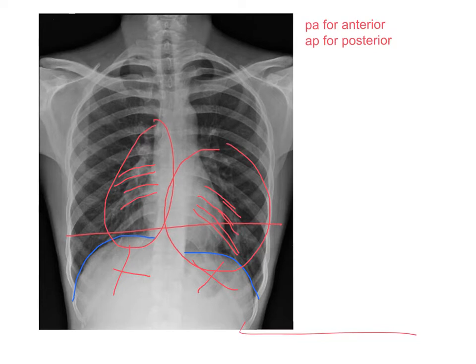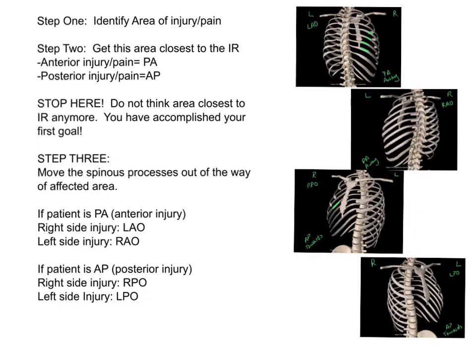So in order to get a more black and white contrast, in this image in particular, I would lower my KVP to improve contrast. Think thoracic spine technique versus chest technique.